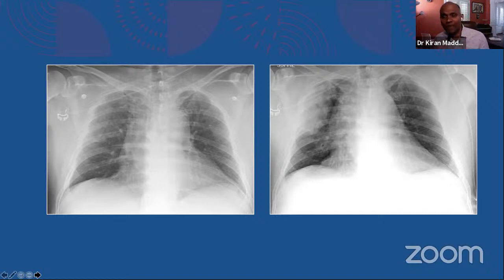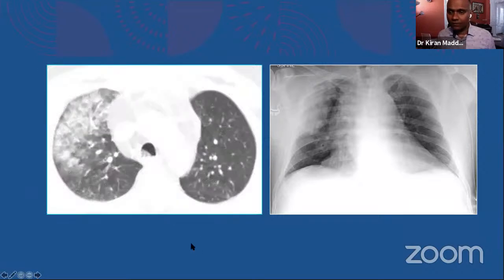This is about the parenchymal opacities. So to narrow down, does anybody want to throw out a diagnosis? What could this be? Even if you give a wrong answer, even if you say pneumothorax, I'll take it. But say something. I don't see any answers. That's fine. We have to go for a CT here. Any more now?